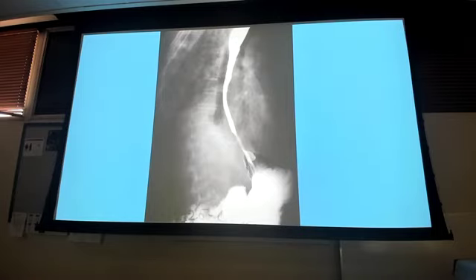Right? So we've got another constriction or stricture coming down. Look how thin it gets. I can't really tell you if this is a hiatal hernia on this one yet, because this is like an oblique view. If you look at how the ribs are and everything, it's this weird oblique view. So where's the diaphragm? I don't know. But I can definitely tell you this is an esophageal sphincter or stricture or constriction, because look at how small it gets down there towards the end.